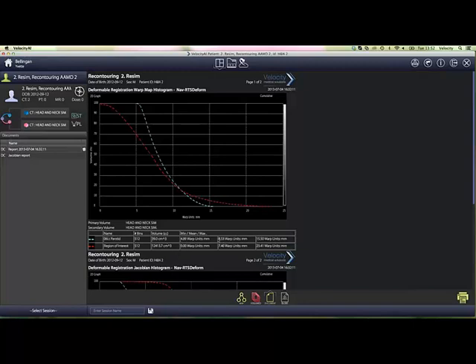So where does that come from? If we go to this area and I scroll through the image, you can see in some places it almost looks, and over there, it looks as if the deformed parotid has actually expanded. So the Jacobian doesn't know where to expand. It can just give you the volume in 3D.